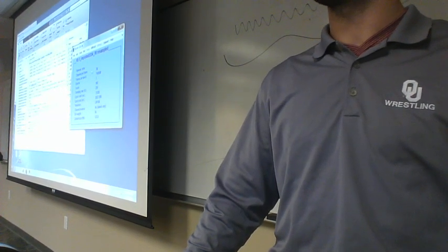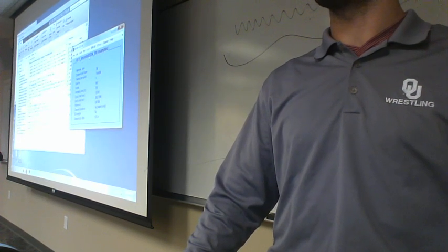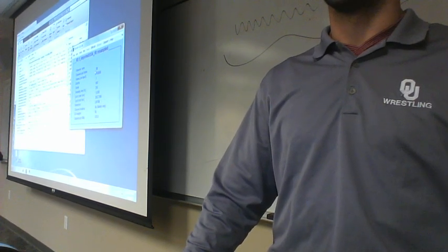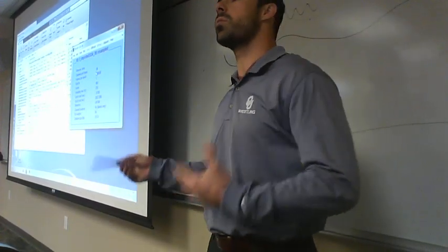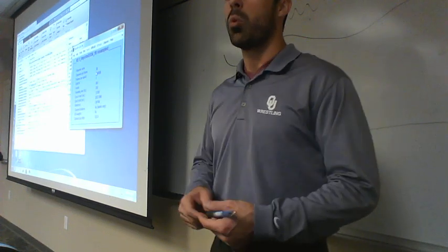Okay, so now I should be very similar to where you guys are at. We should have a file loaded, the subject number imported 3334 dash filtered resampled. Make sense? All right. So what do we want to do from here? This is all within what we're going to call pre-processing. We're getting the data ready for more advanced things. Because what does it tell us here?